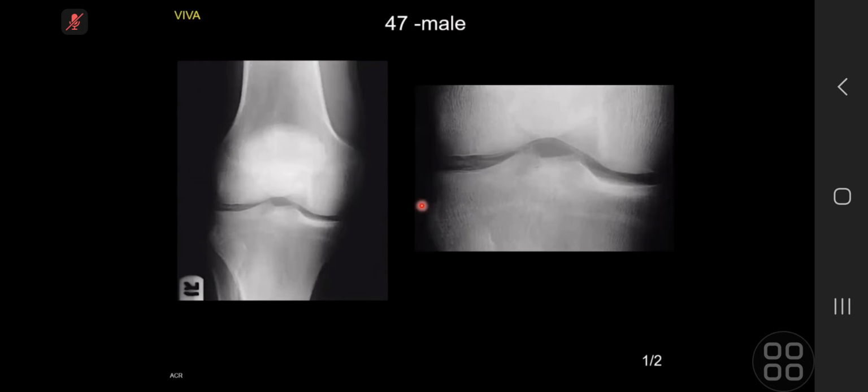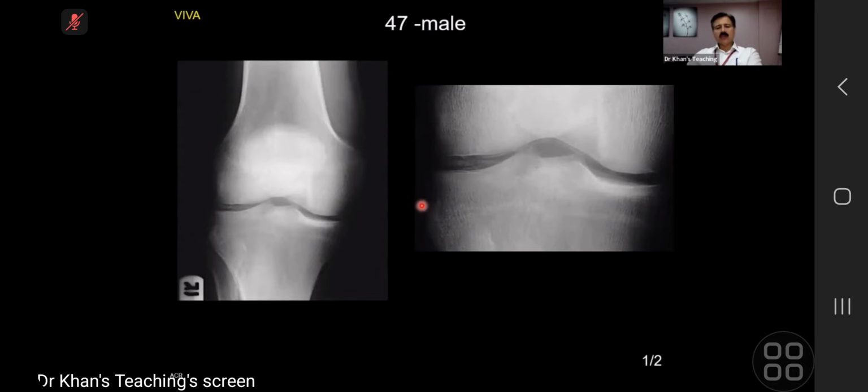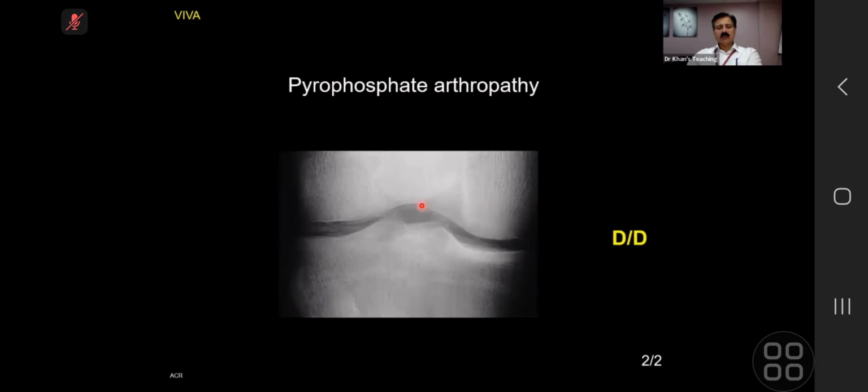So it has a differential diagnosis that does include alkaptonuria. So, this is knee joint, and in the knee joint, alkaptonuria, definitely you can keep it. But the point is that in knee joint, CPPD should be up there, calcium pyrophosphate deposition disease. And in knee joint as well as in the wrist joint, this is quite pathognomonic.